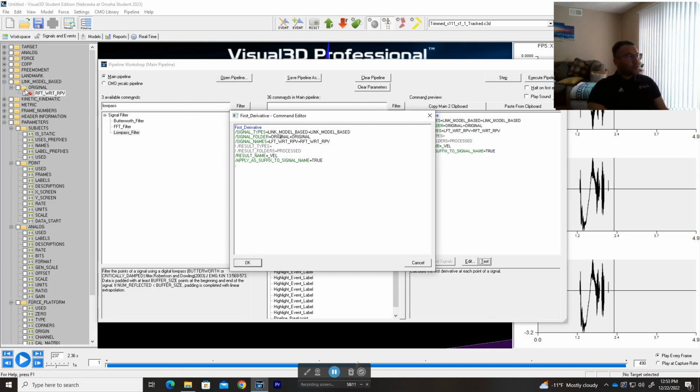And then under that you go to the folder within that type, which is original, and then you type the name. So left foot velocity, left foot center of gravity basically. Also, you can either want it for one signal, or you can create as many signals as you want.